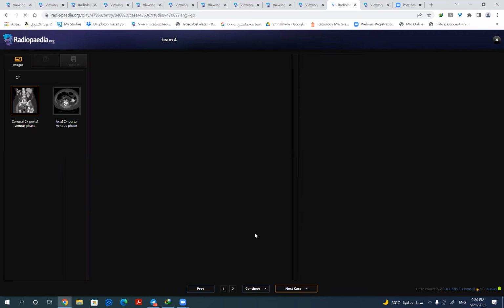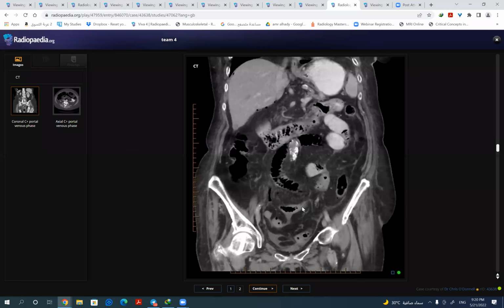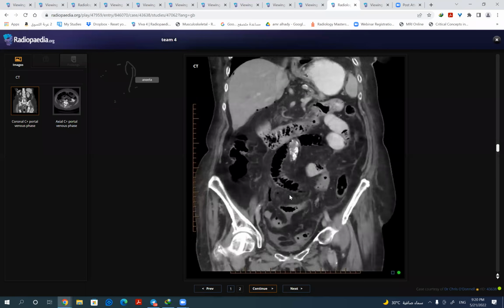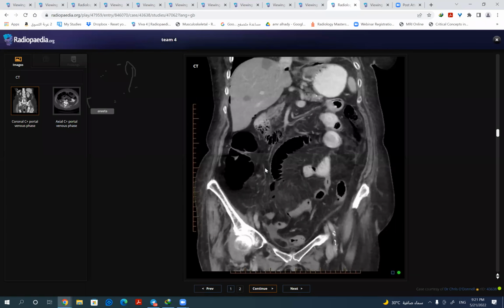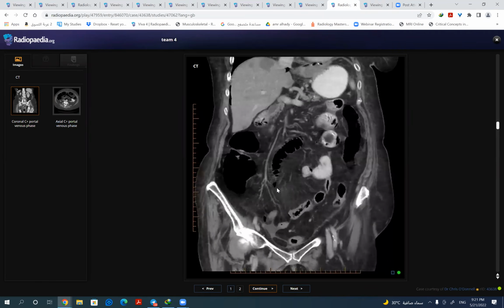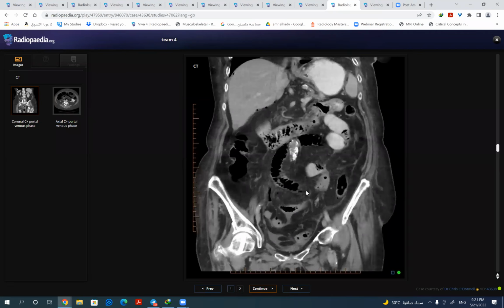This one, yes. Diverticulosis is okay, but there is a sigmoid colon carcinoma, which is perforated, and is the cause of the pneumoretroperitoneum here. It is uncommon to see perforated colonic cancer, but it can happen, and they might start with the plain radiograph showing pneumoretroperitoneum. The patient is known to have colonic carcinoma and chemotherapy, but later on developed pneumoretroperitoneum due to perforated sigmoid carcinoma, for example. And here you picked up the peritoneal deposit and the bilobar hepatic deposit. So there is no sign of bowel obstruction, only perforated sigmoid carcinoma.